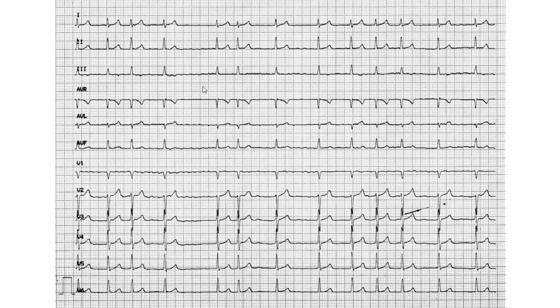We don't calculate it. Point 6, QRS complex. You go through all of them, okay? Or rather, not all of them. There are 3 points: there's QRS, there's a prolonged Q, and there's Sokolov.